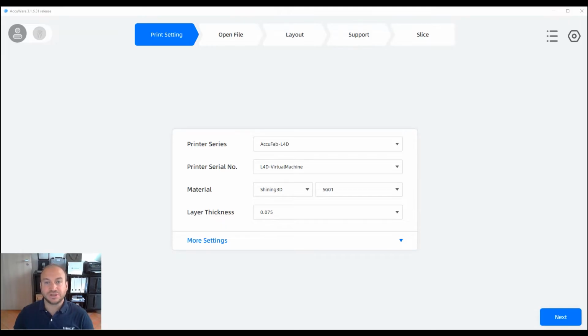Here is Filippo, Application Engineer Manager for the dental products in EMEA. Today we will see together how to unlock Accuware in order to have access to all the resin parameters. And we will also see some tricks and suggestions in order to add a third-party resin.